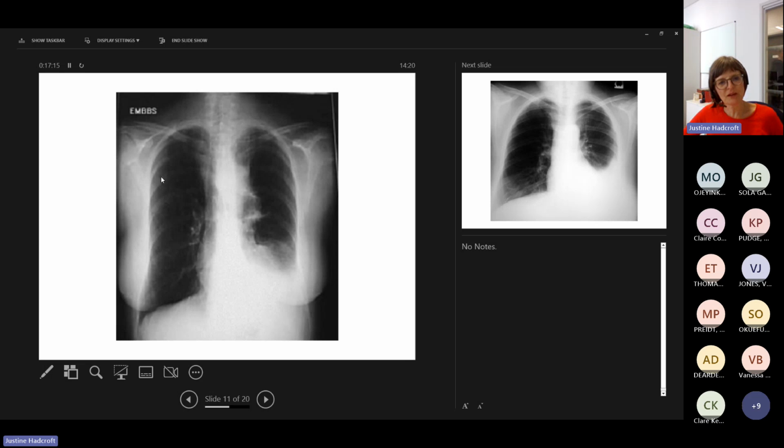So I think if this person had bilateral pneumothoraces that were so large, they probably wouldn't be sitting up for a chest X-ray. They'd probably be dead. So I think the blackness is, you're quite right, there's more air than usual in the hemithorax, but rather than being in the pleural space, that air is in the lungs. So I think they're really hyperinflated lungs, and the diaphragms are quite low again, aren't they? You can see lots of ribs. It's so black it's difficult to count the ribs.